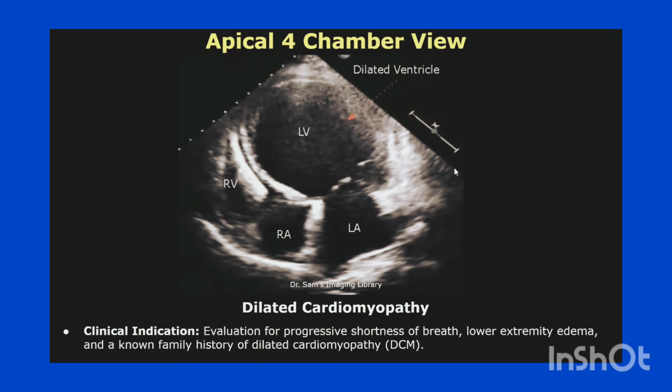This report is of dilated cardiomyopathy. Clinical indications are evaluation for progressive shortness of breath, lower extremity edema, and a known family history of dilated cardiomyopathy.